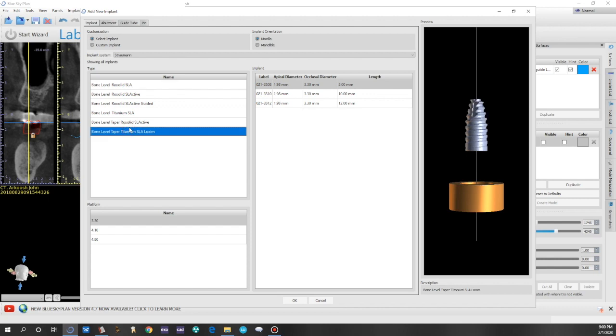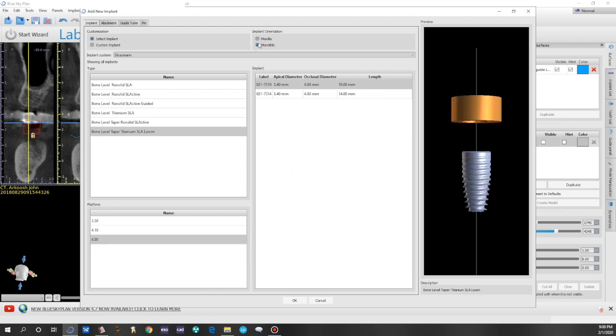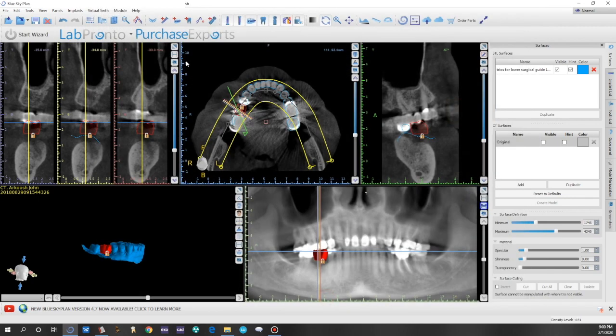You can also get back out of the plan and measure the bone to give you a better idea of the implant size and width, which we'll show you here in a second. In this case, we just clicked on the 4.8. We clicked on mandible to make sure it's in the right orientation. But here we will show you how to measure using the measuring tool. The width of that bone, you can see in this case, that's a pretty extremely good sized bone. And now you will feel pretty safe that whatever size implant you will choose there will be sufficient.